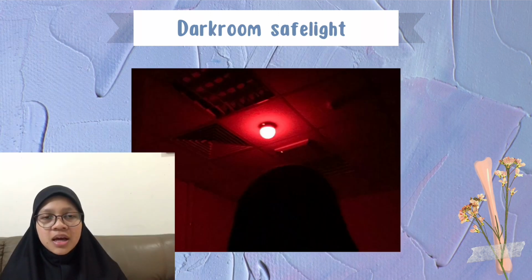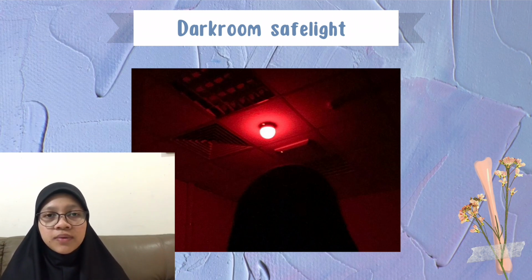Darkroom safe light. The darkroom safe light provides light for working in a darkroom, so the radiographer can see while developing the X-ray film. These lights are designed to provide light in a wavelength that will not expose the X-ray film, because the X-ray film is a light-sensitive material.